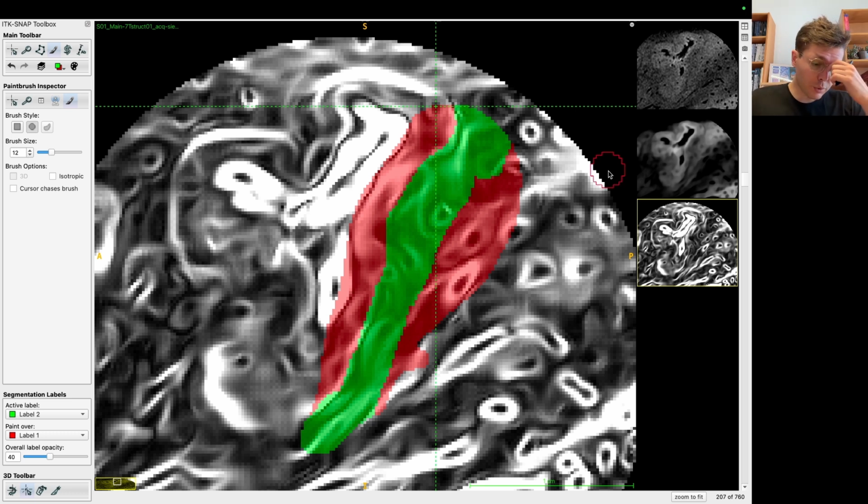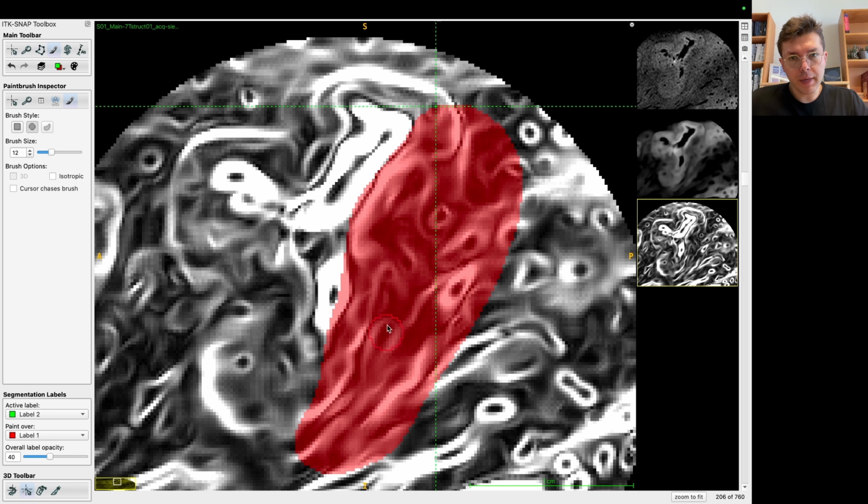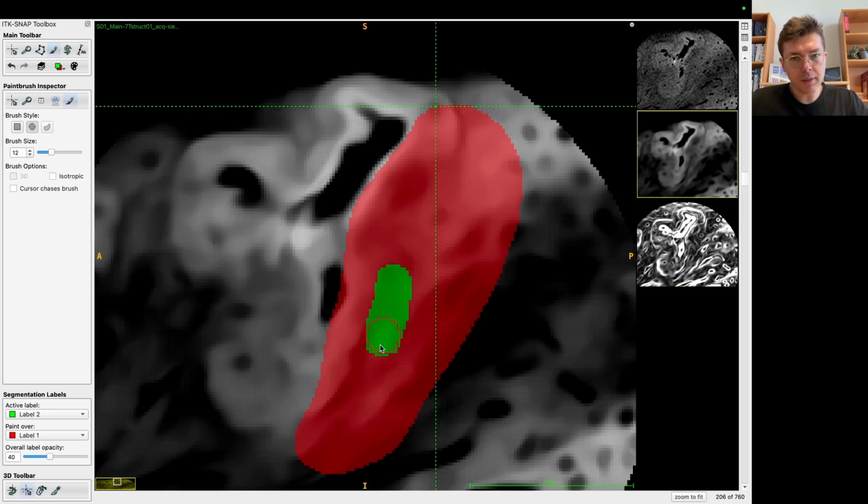And actually, this goes back to our eventual paper, because I think that effect that we are seeing here, the very gradual change between the white matter T2 star weighted signal and the gray matter T2 star weighted signal being almost the same, I think this only happens in A1. And we will just, I think, at the end, pick up this in our analysis. Because here you see the gray matter really looks different, and there it really looks different. But there in the Heschl's gyrus, more on the anterior part of it, as it should be, it's really hard to detect a boundary.